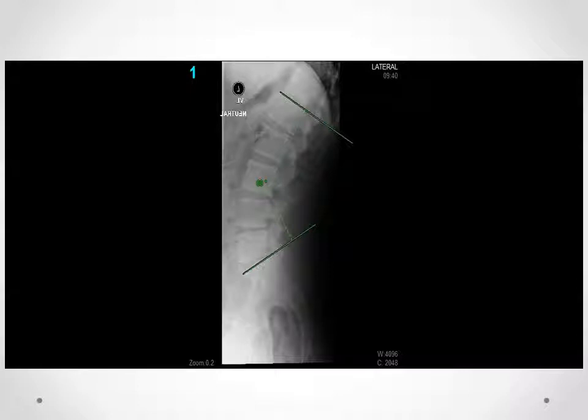It gives you a baseline value from which you can make your assessments as the spine globally and individual segments go into flexion, and then globally and individually as each of the vertebrae go into extension. And it allows you to assess for motions from baseline in both flexion and extension.